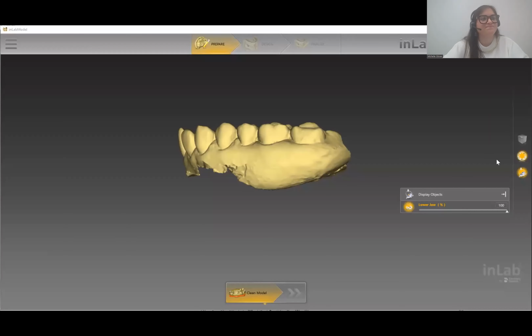All right, so I'm going to share my screen again. All right. So if you are just joining us here after pausing, I hope your mouse clicks are going well. Again, I do strongly encourage you to take the time to learn the mouse because half the battle at the beginning is just learning what the left does, what the right does, what the middle cursor does on your mouse, whatever it might be. Once you get comfortable with those things, the workflow becomes that much easier.